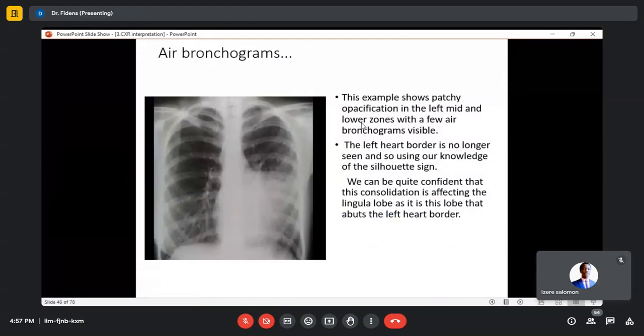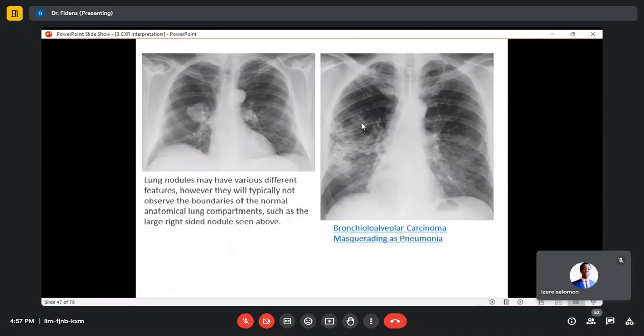Lecturer, I have a question. Ask. On the next image. Which next image? This one?